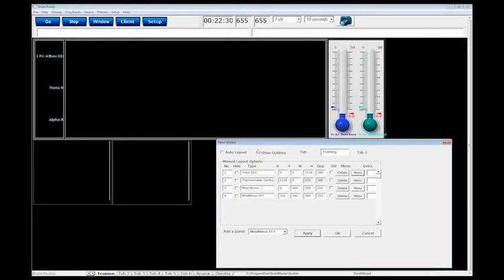So one of the things I want to stress right here is to design your screen to whatever's going to work best for you. As I've done this a lot, most of my designing I do by pixels. I'm used to the size of my screen, which is 1600 by 900 resolution. And most of the panel design protocols that we put out are designed on that screen. So some of you might notice that, hey, this fits perfect. Some of you might go, I don't see everything that's on it. If you don't see everything, you can open up those protocols and readjust them so that they fit on your screen, or you can just start from scratch and design them on your own.